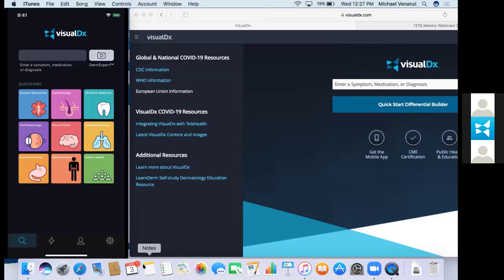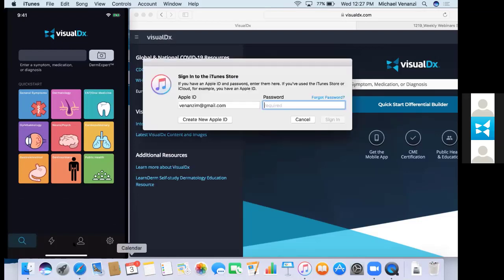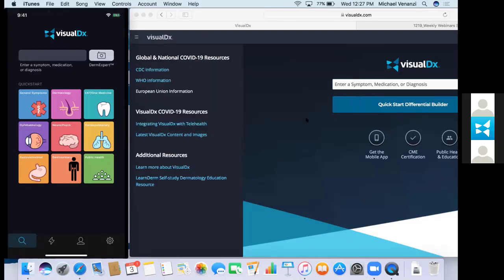How I use VisualDx in my workflow: you're busy, you have to see multiple patients, so I usually use it mostly as a rapid reference. You can see your treatment options, your billing codes, and things like that. You can establish patient trust by reviewing the images with the patient, and that takes no time from your cell phone. And then also the handout that Mike taught us about, you can send that from your phone or from the desktop, and it's not sent from your personal email address, but it's sent from VisualDx. You can even have it translated to Spanish. So all of those things really help speed up your workflow. It's a lot quicker than digging for a handout in the old filing cabinets like we used to do.